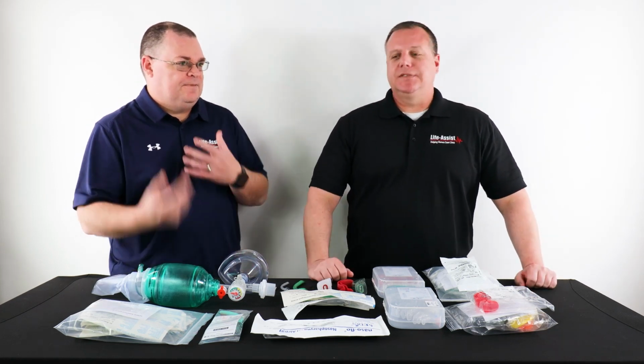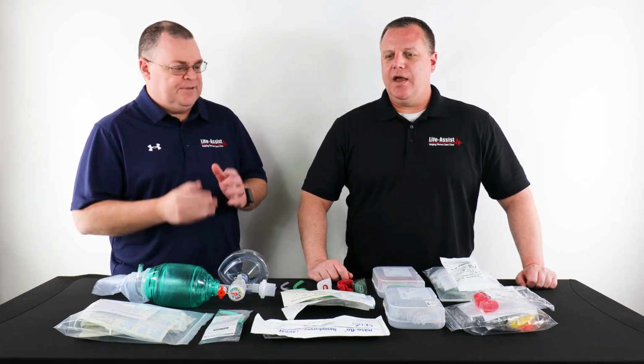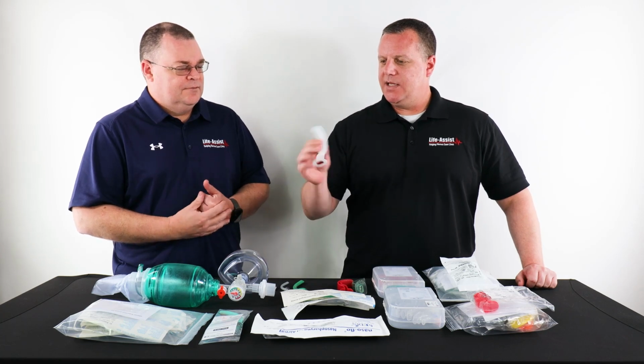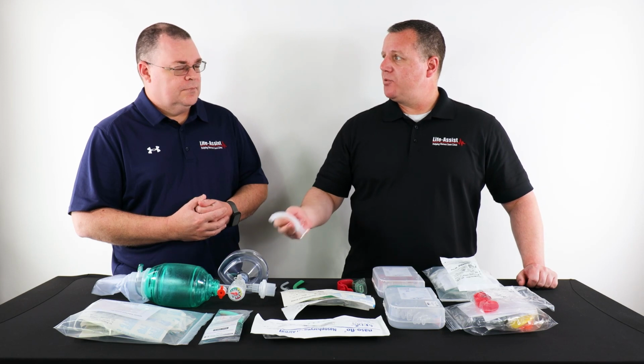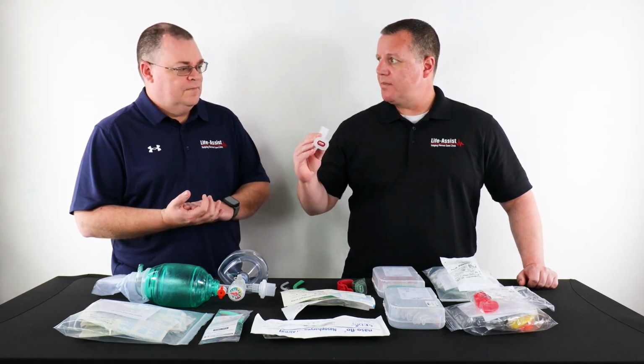Sounds very obtrusive. In my experience, that's more like an advanced skill, but these are still basic? You would be surprised. These skills can be performed by EMTs, EMT intermediates, and paramedics. Pretty much anyone with any type of EMS training can insert these.